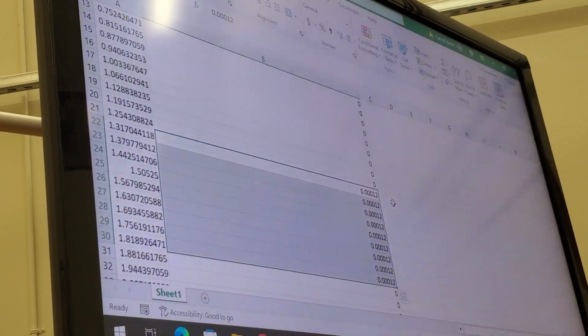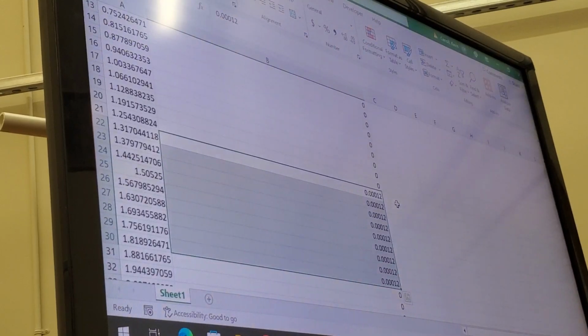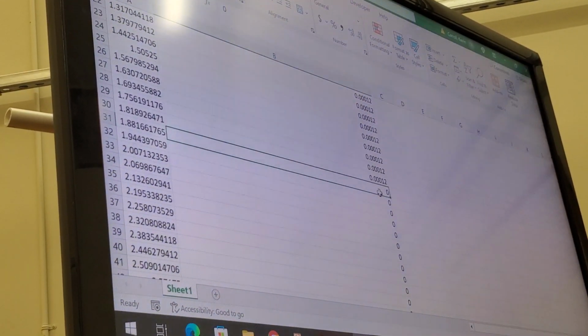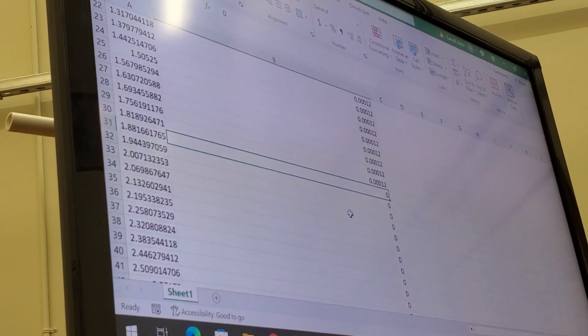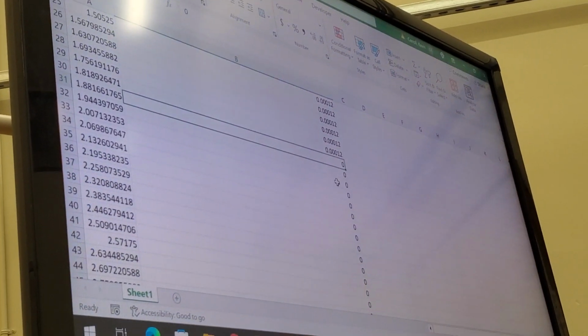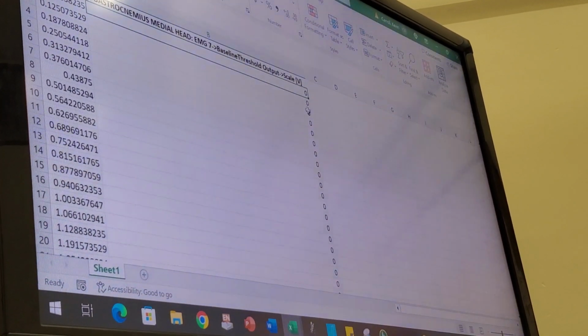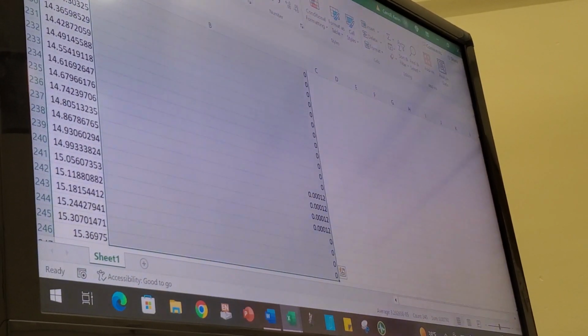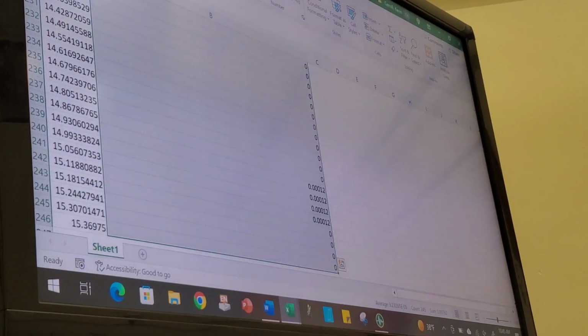So that's how you know exactly where the contraction starts and stops, because it goes immediately from that vertical line to 0. So 0.00012 means the muscle was activated and the number 0 means deactivated. Correct.